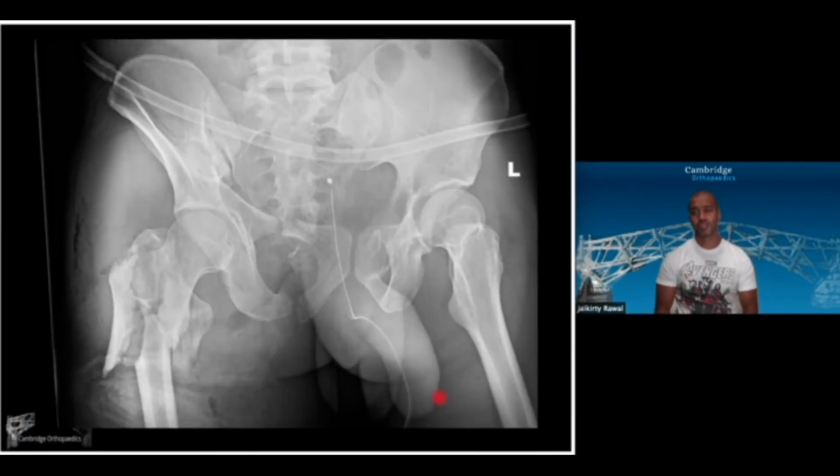Here's another one, just to reiterate the point, and this is a lovely X-ray, very unfortunate injury. All right, catheters in. That isn't the first thing you should spot. Proximal femoral fracture with gas around it. Open proximal femoral fracture. Something going through here.